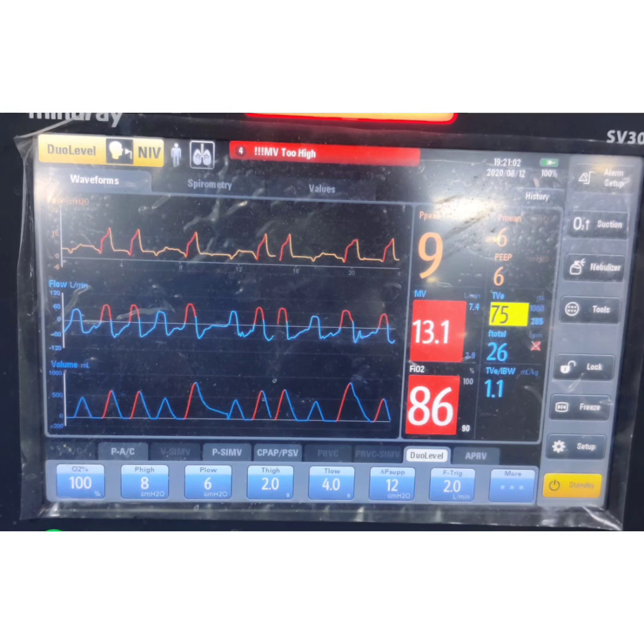Let's see this example. Here, if you see the flow, we can see this red area. Here inspiration is happening, so here the positive pressure is coming. If you see during the flat line also, some negative deflections are coming, and positive deflections are also coming, which indicate inspiration and expiration occurring even at P low value.